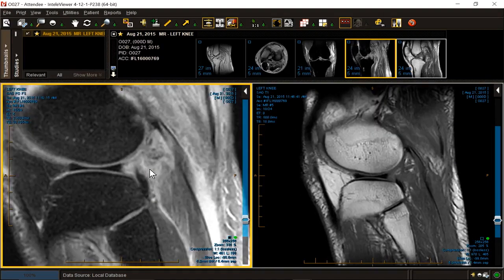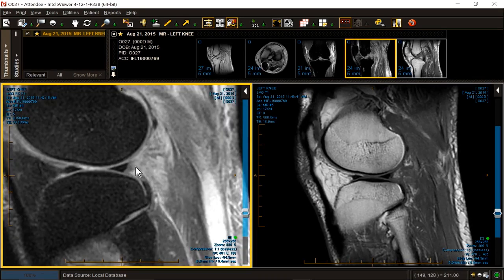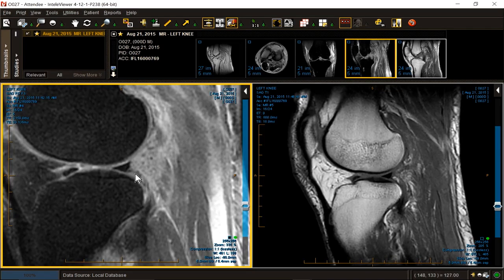What else has been injured in the posterolateral corner? Well, the popliteotibial attachment, intact. But the menisco-popliteal fascicles that anchor the lateral meniscus to the back of the knee, they're gone. There's an upper set and a lower set. They're broken down into medial and lateral upper sets and medial and lateral lower sets. There's one of the ligaments barely present and a little squiggly. The upper ligament is gone.